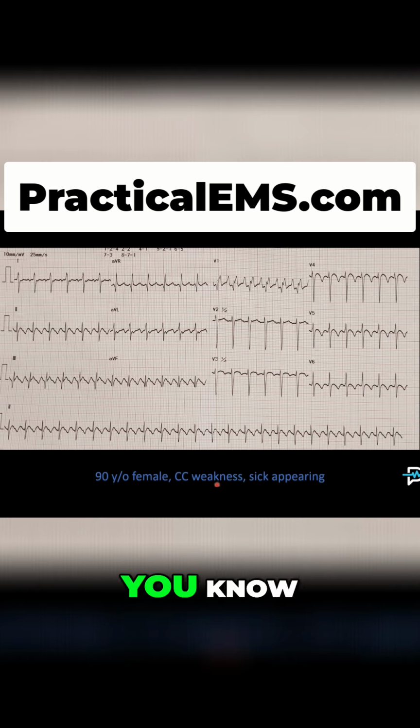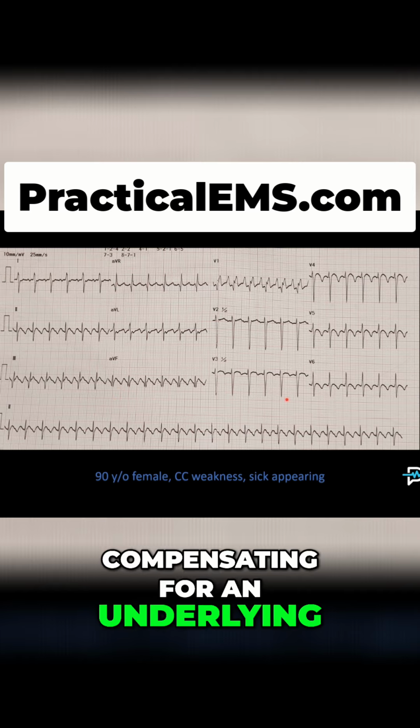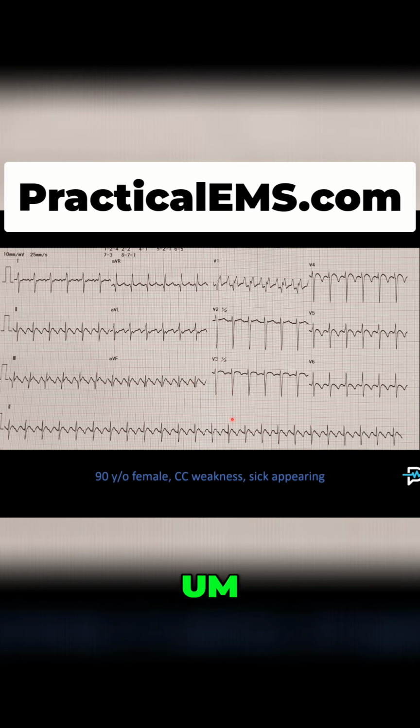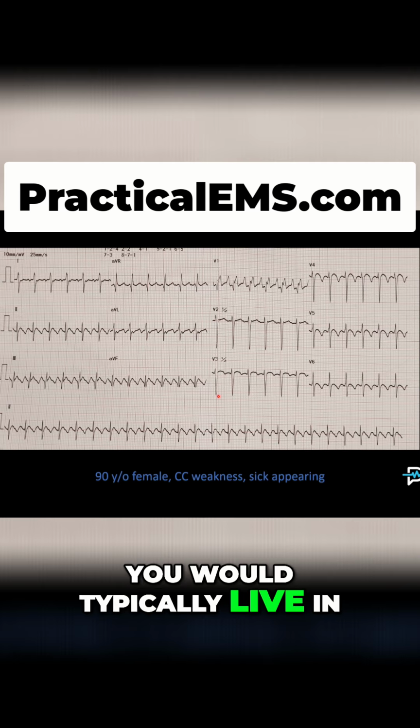This patient, if they're pretty unstable, might need some rate control. You want to make sure this isn't a rate compensating for an underlying septic illness. But if this is just a pure dysrhythmia problem, you can try to rate control this patient. Probably needs electrical cardioversion though, because 2-to-1 A-flutter is not a rhythm you would typically live in.